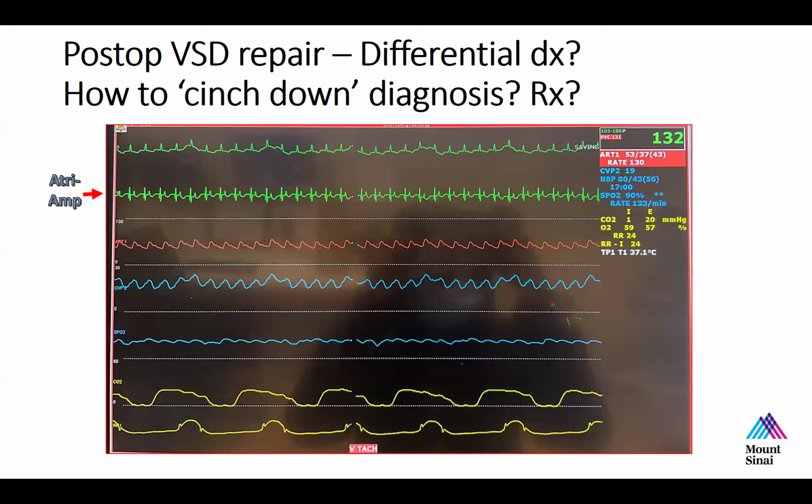I would just assume that's pointing to a P wave, but I don't see anything evident of a P wave there. It just appears to be a QRS complex. Well, which is the QRS? Is it this complex that I'm pointing the arrow at, or this complex? The first one. This one, right?